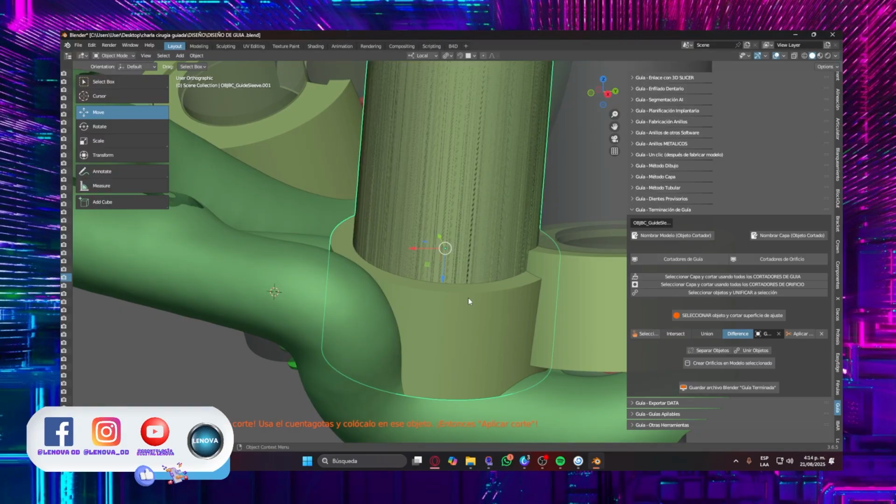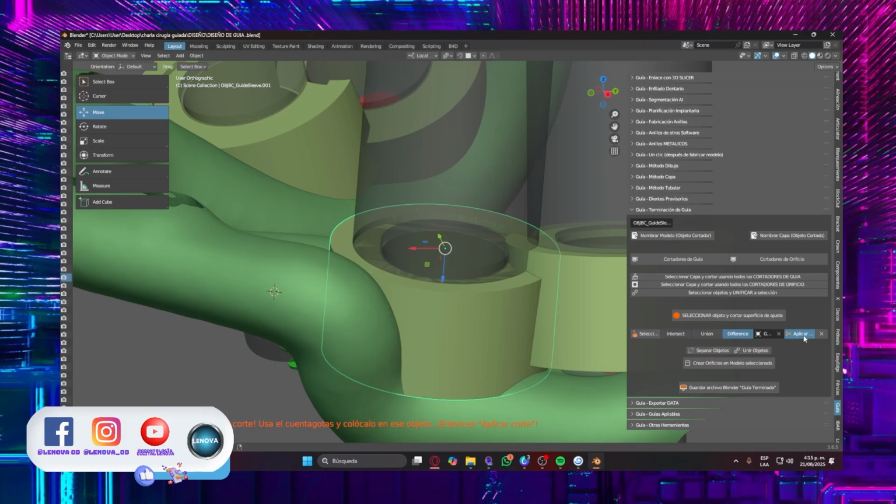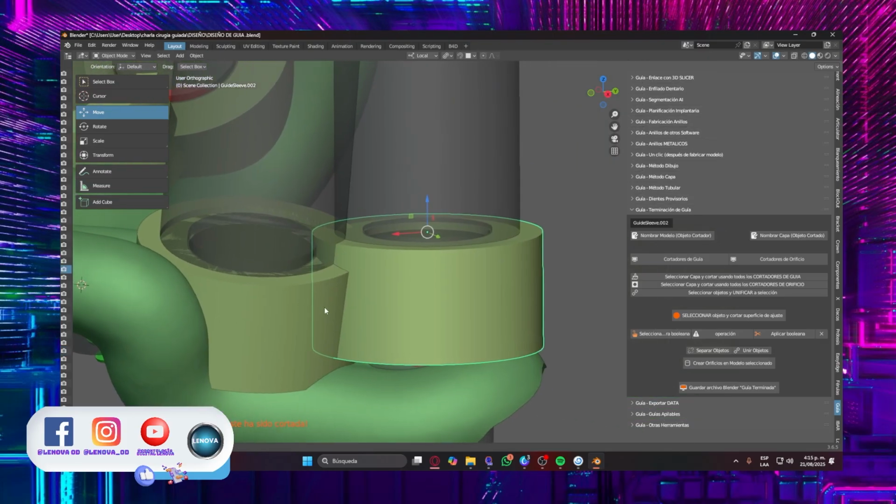If this happens to you, don't worry. This is a cutting error. What you do is select with a click. Look at my mouse. One click here, one there. I already have the shadow. I press the S key, I decrease its size and I solve the problem. But I must select the drum again to be able to apply the cut, and the action is reflected. If I don't do that exercise, it is not executed. Let's go with the next drum.